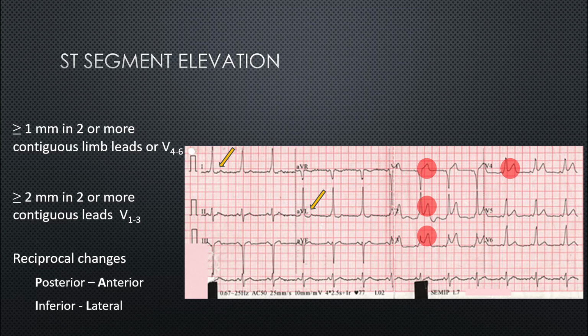And while we're discussing systematic interpretation, the most often missed STEMI are those that affect the lateral walls of the heart. In these cases, the ST deviations are quite often subtle and don't activate concern based on a quick pattern recognition process alone. A very conscious review of all the regions is recommended, followed by examination of the reciprocal leads.